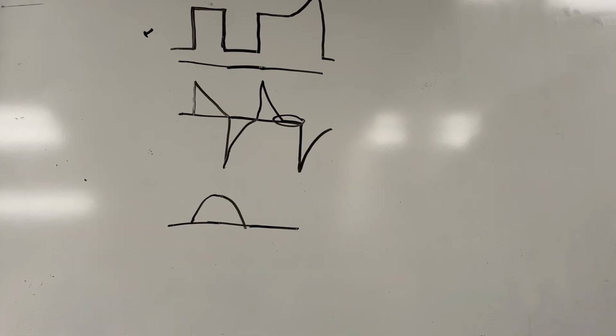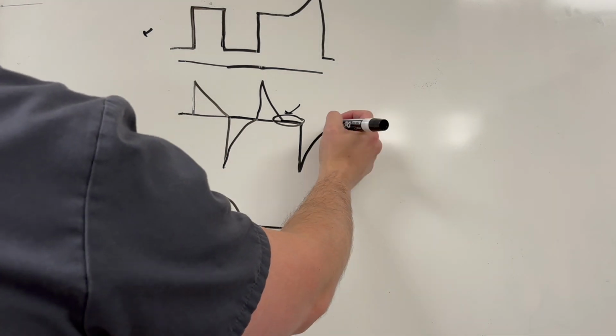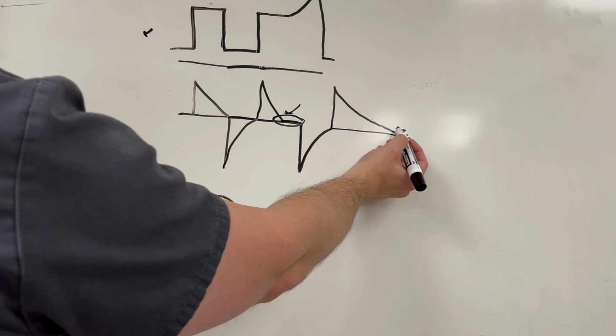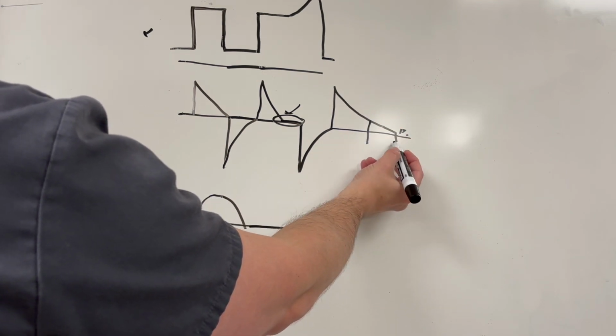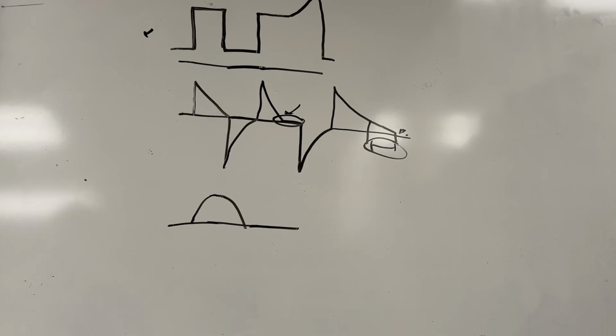And so what you'll have to do is figure out on what breath it is happening. Is it happening on my mandatory breaths and our I-time is set too long? In which case you would see something like this. Is it happening on a spontaneous breath where we're just going way down here and we have this set at like 1%? If that's the case, you're going to go up on your percentage, because if I put it to 25%, let's say, then I would cut it off right here, and we would cut this much of the breath off time-wise. That would put them in their inspiratory phase on their spontaneous breaths for less time, and they would get more back to looking like this.